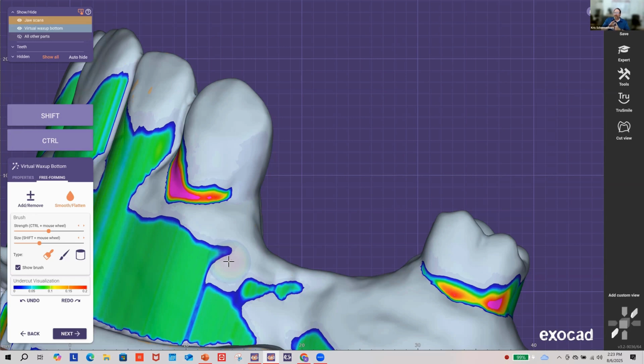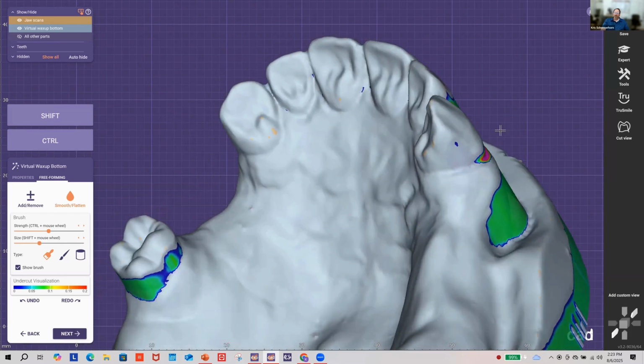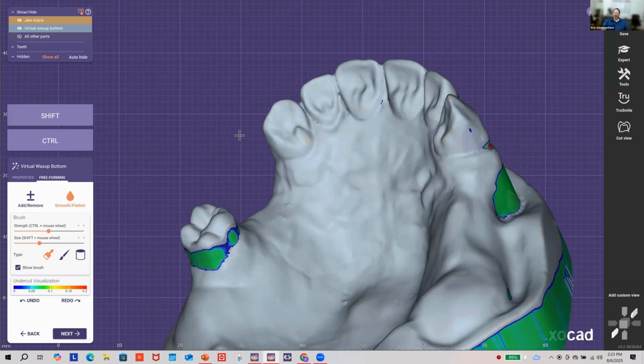But in order to have it that thin and it not be flopping in the breeze because it's too flexible, we've got to make it wider. So when it's on the tissue, we want it to be passive, so as it moves up and down, it can rub on the tooth. It's going to do absolutely nothing to enamel, but you don't want it rubbing on the tissue, or especially at that juncture. And this is where flexible partials really go awry, and where people complain, oh, they strip tissue and they do all this. You just got to use common sense and design them appropriately.